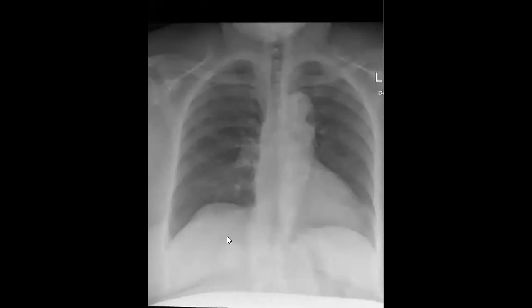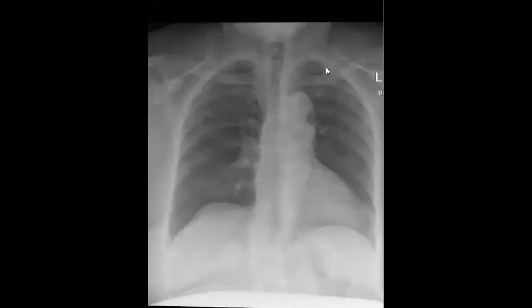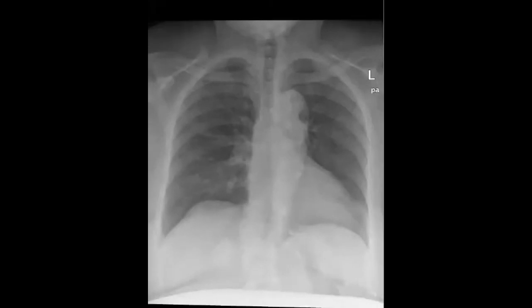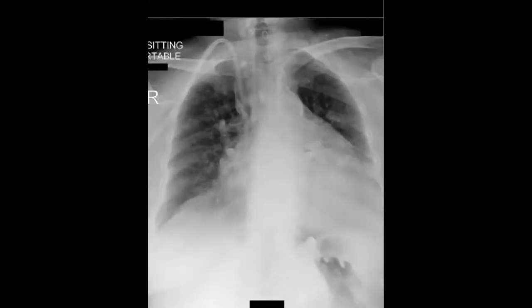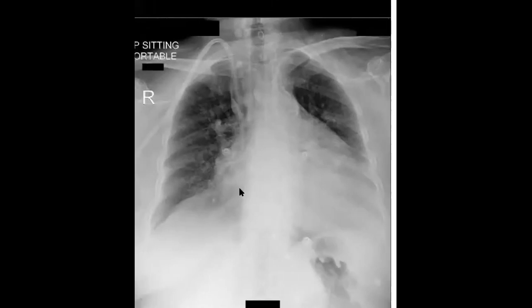This is another example, maybe more obvious, with calcification in the liver. So you think it is a hydatid cyst? Yes, here. You can just put a differential diagnosis, and one of them will be the hydatid cyst. Yes. There is, yeah, cardiomegaly, and you should comment on the tube here.